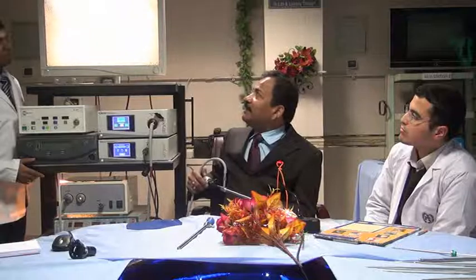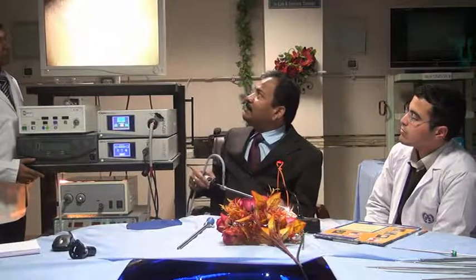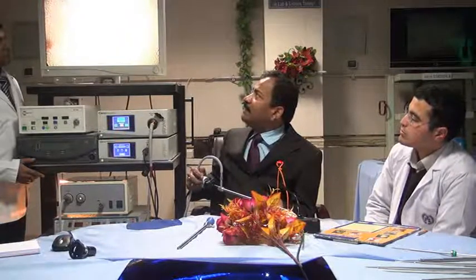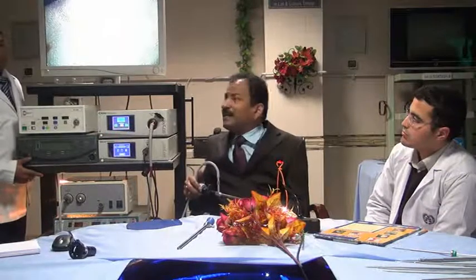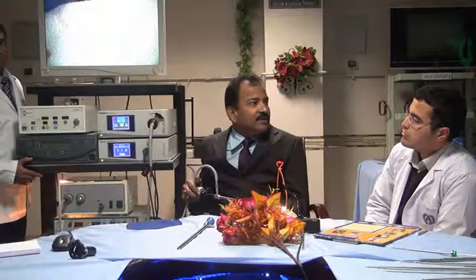First I am increasing the intensity a little, then let me focus a little bit here, and then I will do the white balance. And this is white balancing. Okay. And then it is done. See? Beautiful. There is no yellow tinge of this halogen light source, an inferior quality light source.